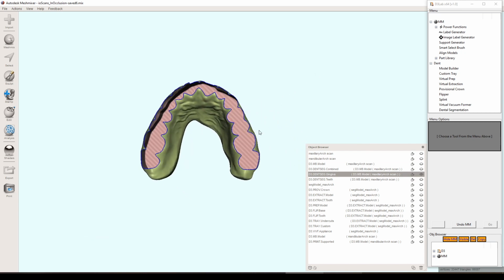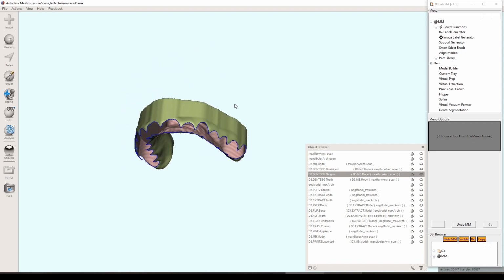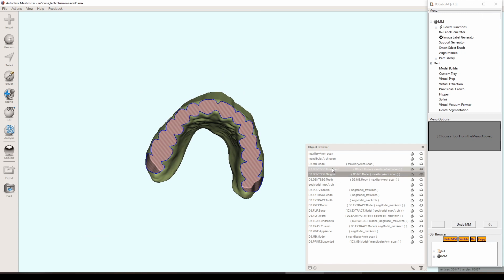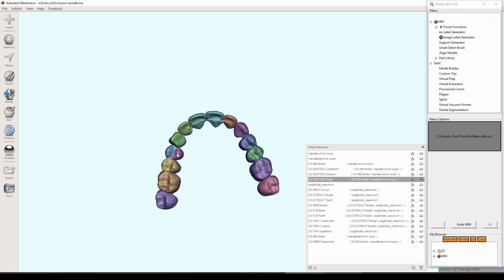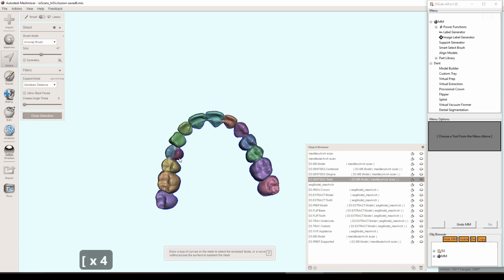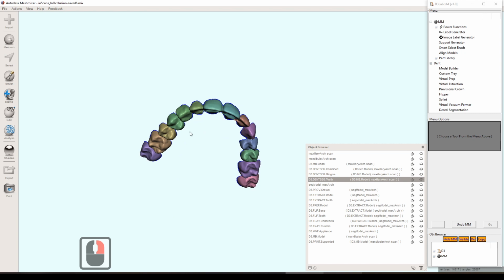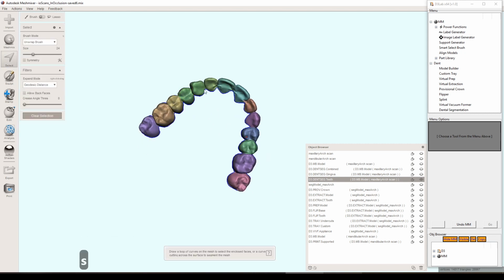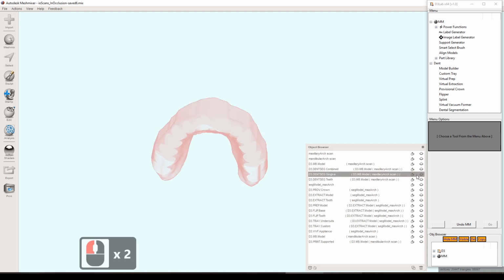I'm thinking you could use this if you were doing a full mouth extraction case and you needed a simulation of what their jaw would look like. So from here, this gets spit out, you get the combined model, you get the gingiva, and you get the teeth. And you can see there, those two are separated in color, but it's really easy to just double click and press G, or there's a tool up here to make a face group, or Control G, sorry. And there you go. It just combines it into one. That's easy. So there's the teeth here, and it segments out the teeth, the gingiva, and then, like I said, it's combined.